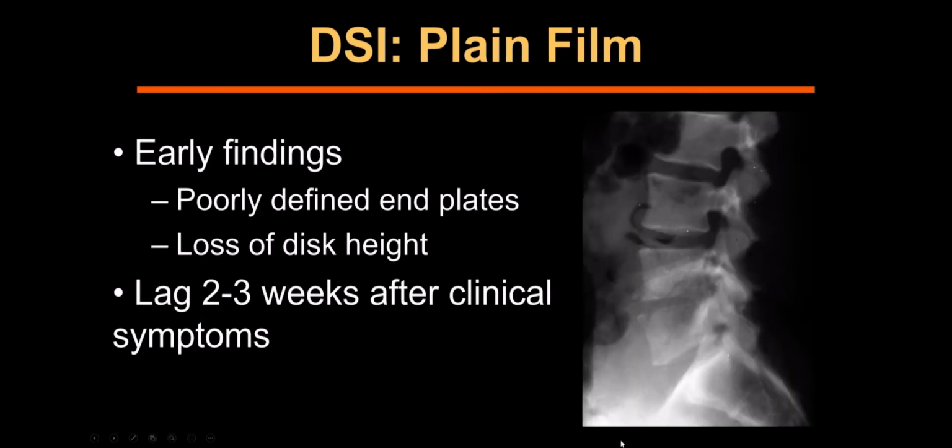Well, is plain film any good? I mean, a lot of us will screen for back pain with a plain film. And in this case, if you really zero in, you'll see that there are poorly defined end plates. And remember that vascular anatomy that I taught you. That's the first place where you're going to look.